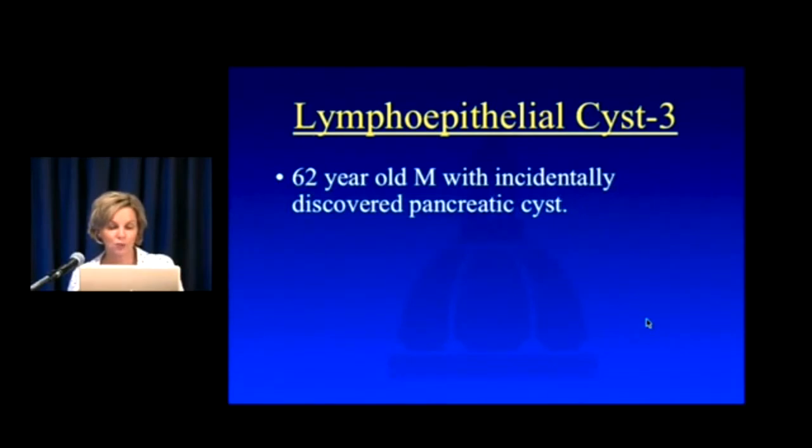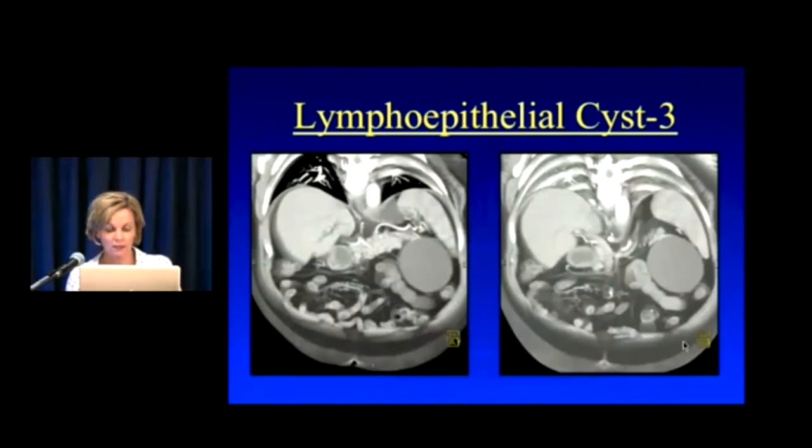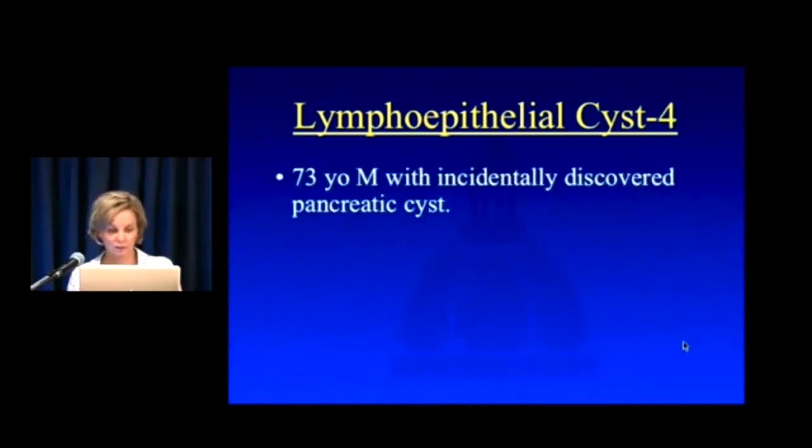Another patient, 62-year-old man, incidentally discovered, again, just really looks like a kidney cyst, right? It's even touching the kidney, touching the pancreatic tail. No aggressive features. This is classic for a lymphoepithelial cyst.